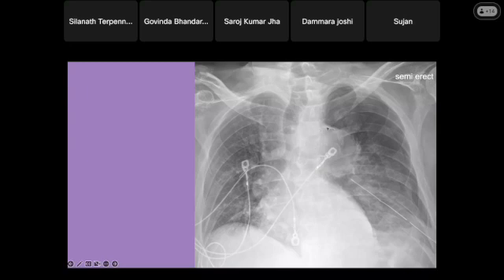Bad, a calcified aortic knob and big aortic arch here. Okay, behind the heart looks bad too. The lung, everything looks bad here. We have a chest tube here. Okay, one thing about a chest tube you have to look at: you have to look at the side port. The side port is here, right there. It should be in the chest. It should not be out of the chest wall. If it's out of the chest wall, that chest tube won't work. This one should work well here.